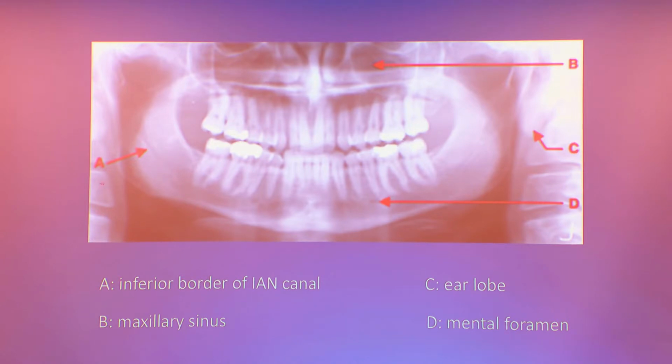So we're getting the opacities of the bone of each of the vertebrae here, but also potentially we'll get the lucency of the disc space superimposed. And it can throw off the diagnostics if you don't realize what's happening. Also, sometimes the disc space between C1 and C2 will end up in this region and look kind of peculiar.